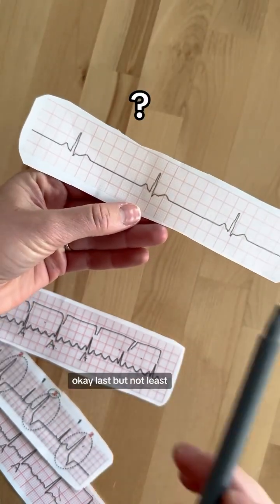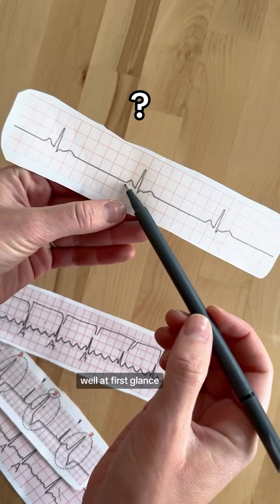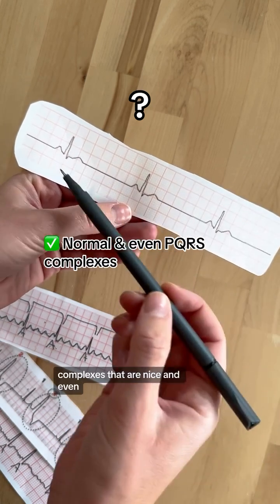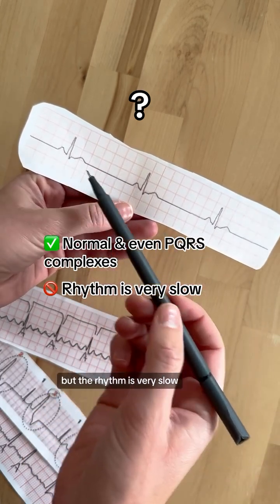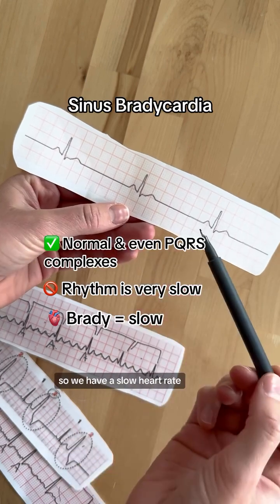Okay, last but not least is this strip. Does anybody know what this is? Well, at first glance, we have some really nice PQRST complexes that are nice and even. And we have a normal looking strip, but the rhythm is very slow, making this sinus bradycardia. Brady means slow, so we have a slow heart rate.